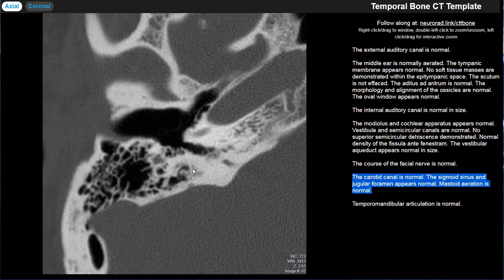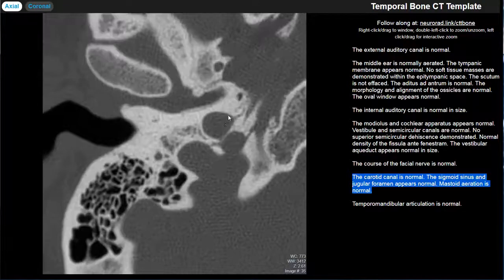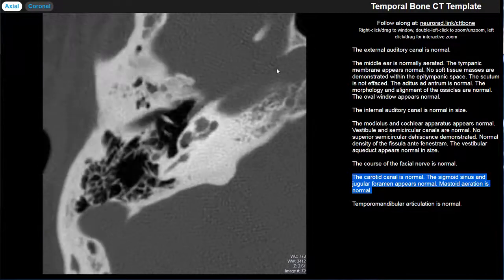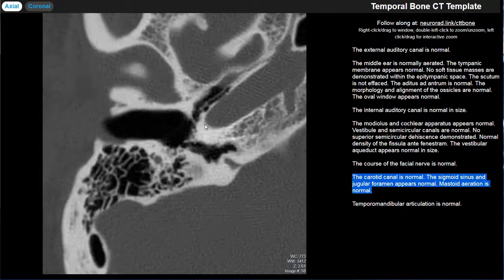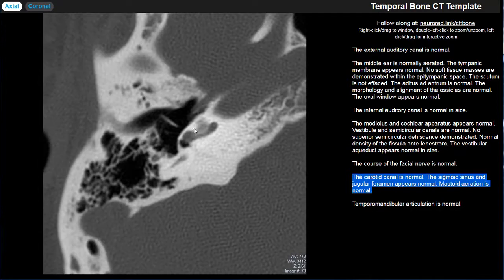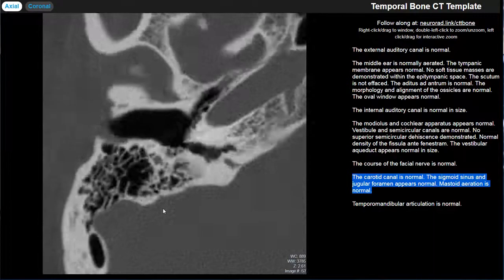All right, and moving on, we have our vascular structures associated with the temporal bone. The first thing I discuss is the carotid canal. So you can see here is the carotid artery. It's going to course up towards the cavernous sinus. You want to make sure that's not deviated too far laterally, actually becoming an aberrant internal carotid artery that courses into the middle ear. You wouldn't want a surgeon biopsying a pulsatile red mass that they think is a paraganglioma, and it's actually the internal carotid artery.